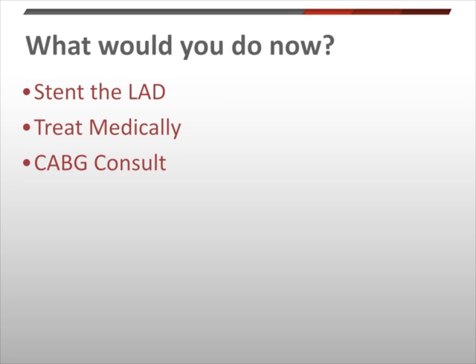So what would you do now? Would you stent the LAD? Would you treat this patient medically? CABG consult. You can think about possibly IABP insertion because of the large thrombus burden. A lot of different options here for us. Where I think most people would agree is that we would stent the LAD.